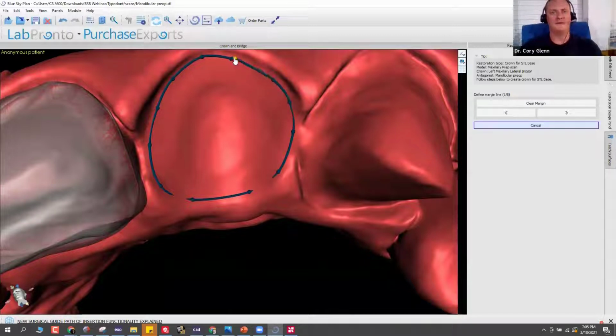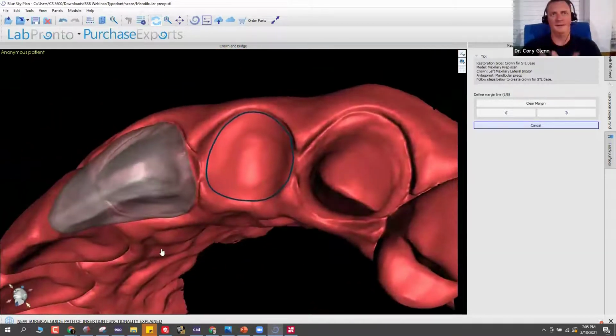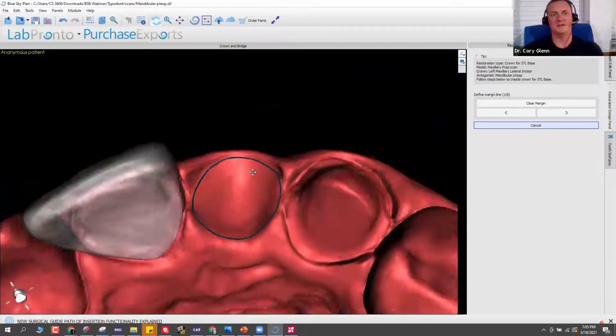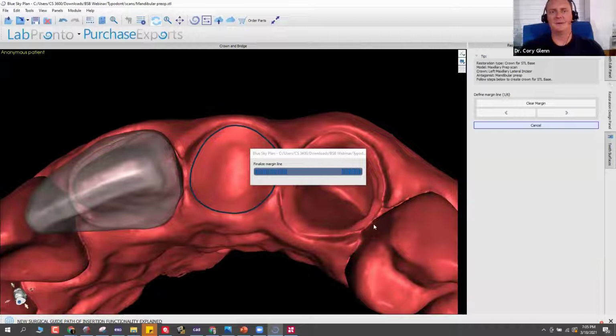But with that said, if it's just a matter of pulling teeth in and orienting them, not long at all. You can actually use the denture module to pull in an entire dentition, and the teeth will be on a chain where you can conform them exactly to the arch that you're working on. So it's very dependent on the individual case, but I could do a full arch provisional wax up in, I don't know, 20 minutes. That's a guesstimation, but I'd say that's probably pretty close.